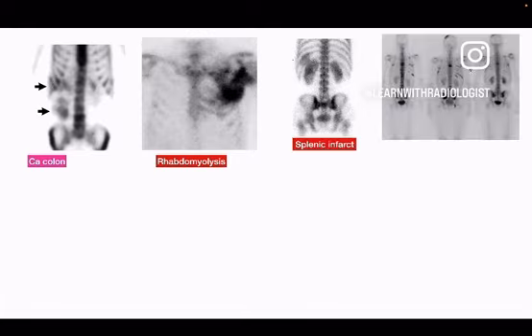We can see there is discrete and multifocal uptake of radio tracer. After a 3-month interval, we can see there is increase in the size of these uptakes as well as new appearance of lesions. And after 3 months of this scan, there is lesser uptake in the previous lesions as well as disappearance of lesions.